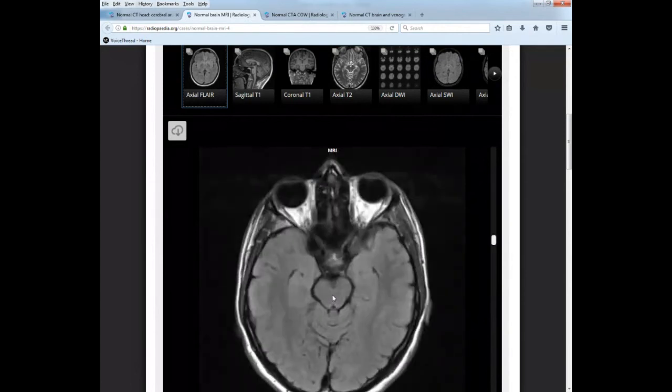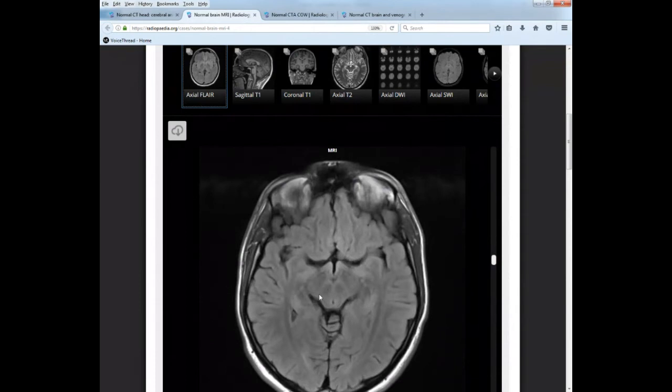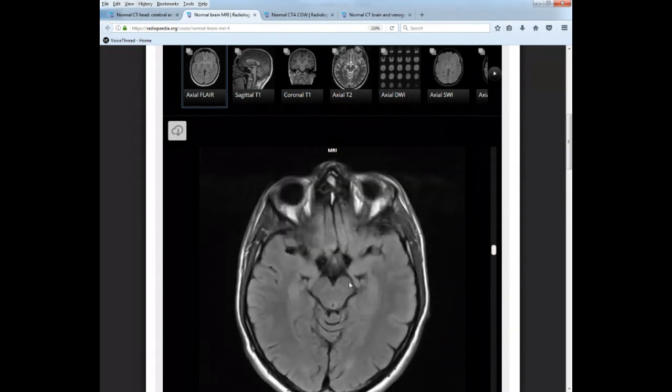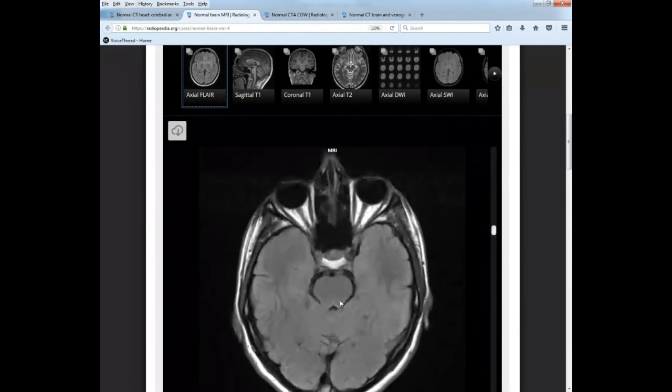Okay? So we'll do that again. Mickey Mouse ears. This picture and this picture are almost exactly the same as figure 3.63 on page 122 in your book. Tectum, cerebral peduncles, cerebral aqueduct or aqueduct of Sylvius. Keep going down, peduncles.